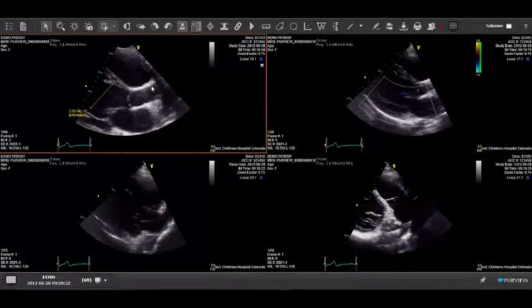After you launch the images from the work list, the hanging protocols decide how the images will be displayed. In this case, we have them displaying in a 2x2 layout. Hanging protocols will also decide if the cine will be turned on or off. If it's off, simply selecting the play button or using your spacebar will automatically start playing the cine ultrasound, the cine loops.